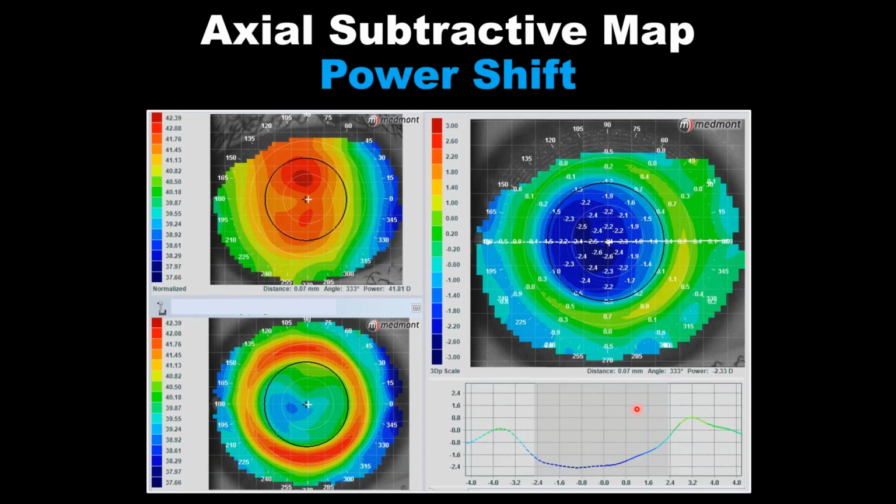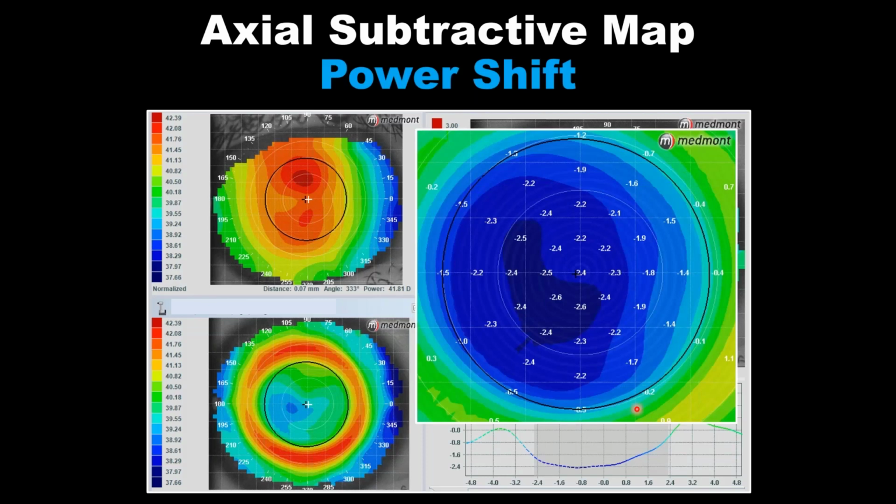Another thing you can do is switch to the numeric Meridian map. And I only use this in myopia control. I find it just clutters the topography, at least for me personally. Some practitioners prefer to know the radii all the way across the surface area. Well, let's zoom in on the center.